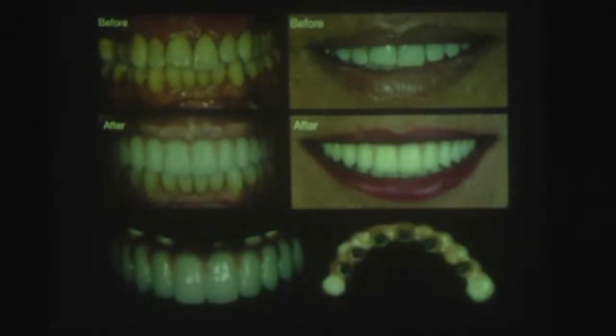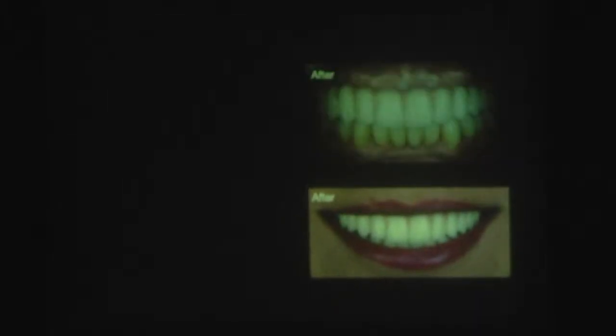So, this is before surgery and this is after surgery. This is before, this is after, and this is the final porcelain fused metal, and we finish this way.